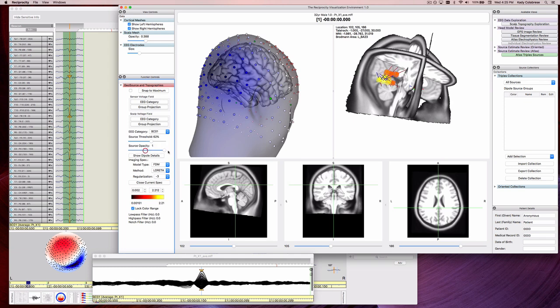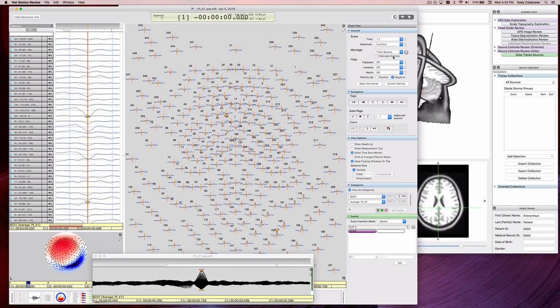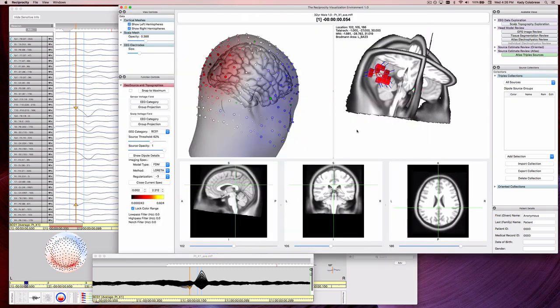Click back to review and change your timescale in the chart to 1:1. Now you can evaluate the temporal stability. Move the time sync marker earlier in time, before the event, to look at how this event starts. Navigate through time using the left and right arrow keyboard shortcuts to move along sample by sample.